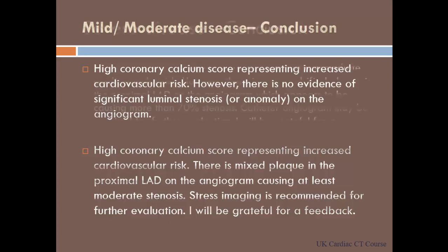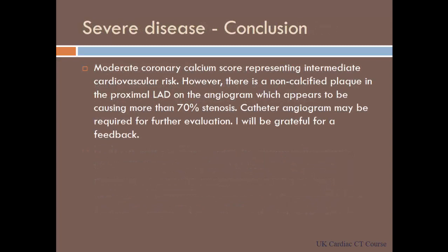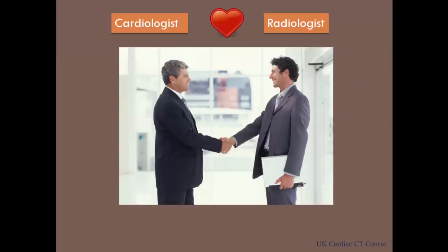Something like this. And the last could be where the patient has severe stenosis on the CT angiogram, and then you may suggest a catheter angiogram. Nowadays I suggest stress imaging or a catheter angiogram based on patient symptoms. I don't say catheter angiogram outright because sometimes cardiologists may decide that the symptoms are very iffy and the patient probably just needs a stress imaging test done. And that's fine. That's overall how we try to assess, interpret, and report cardiac CT.